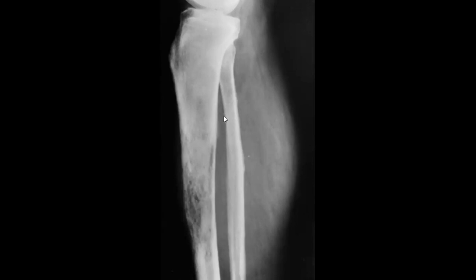Perfect, nice. And what do you think about the soft tissue? So here you mention a bony lesion with soft tissue, right? Okay. Wide zone of transition. Yes, this is the word we are waiting for. The examiner will wait for you to mention this. Wide or narrow zone of transition. If it is an aggressive lesion, you will mention that there is a wide zone of transition.